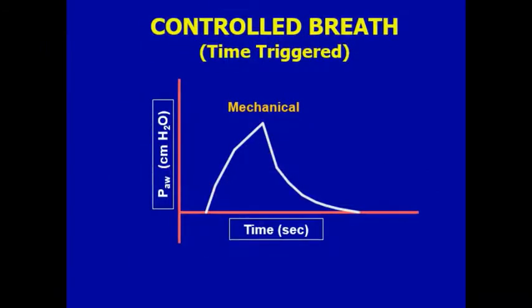This is the pressure time waveform in case of time triggered breath and volume control ventilation. So here this is the time. So this is the time triggered.